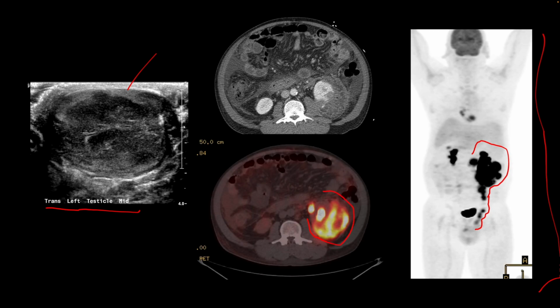left kidney, and on this contrast enhanced image we find that the tumor has grown from the retroperitoneal space into the subcapsular space of the left kidney, and here is another lymph node that is involved. So a very interesting case that we reported as a case report of a primary testicular lymphoma with direct spread.